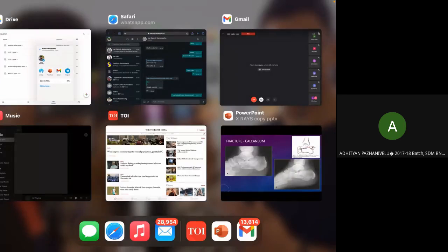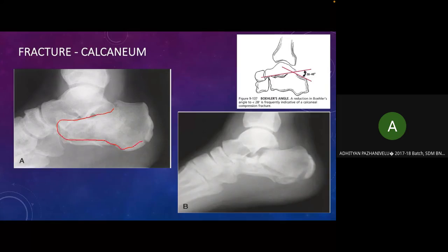And when you have a fracture of this, they don't usually break. They just get compressed into a smaller size. In most calcaneal fractures, unless it's comminuted and broken up, you can leave it with a slab, because the person has to adapt. He will have long-term pain, but you cannot do much about a comminuted calcaneal fracture, because it's like a sponge that has got compressed into a ball. You can't do much about it.